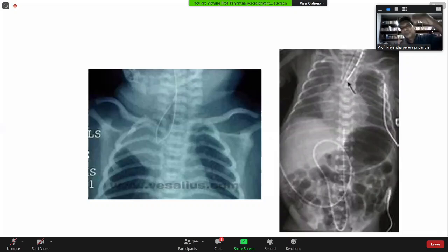If the gap is bigger, you have to go on continuous stretching of the upper pouch to get the two ends approximated, or you might have to put something in between the two ends. So it's important to know whether the bowel loops are there or not. Okay? Any questions?